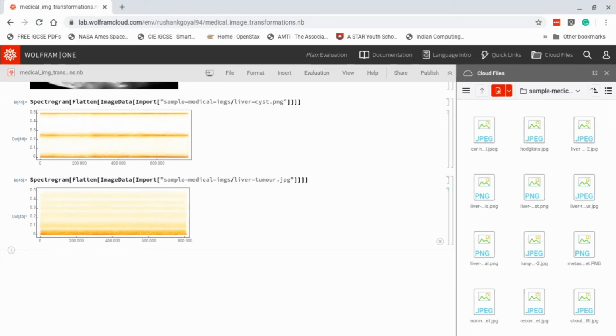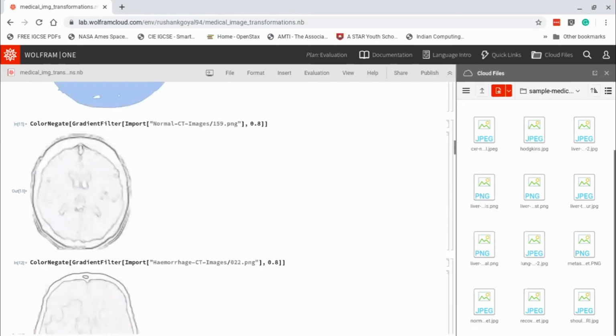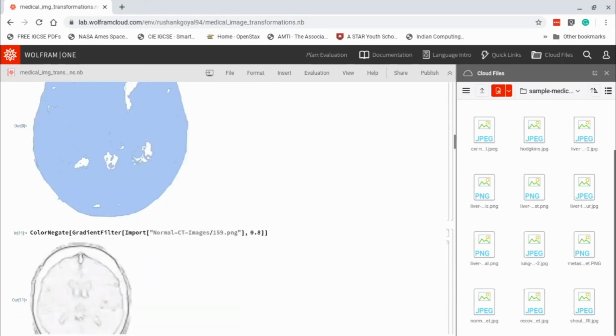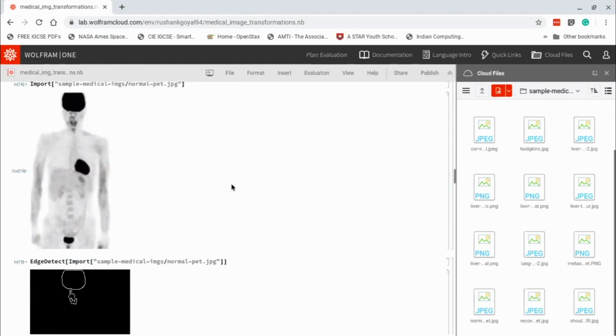So yeah, that's pretty much all I wanted to show. We had quite a lot of images. We applied things to them, and we showed how they could fail sometimes and the importance of just trying different algorithms and seeing which one works.